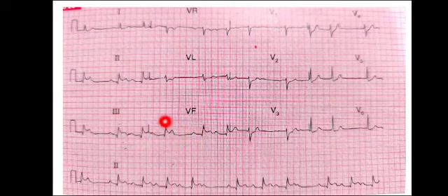Q waves. Another important thing you can note over here, in the strip leads, can you see that there is a PR interval that is prolonged, and then there is a PR interval that is more prolonged, and then here more prolonged and very much prolonged, then there is a drop of the QRS complex. Alright, so this is the Wenckebach phenomenon.